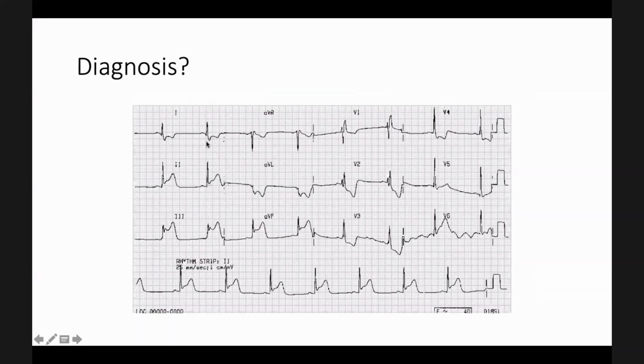Sinus rhythm, yes? You can see the P, Q, R, S, and the T's are of course not very clear, but P is there, Q, R, S is there, T is here. So it's a sinus rhythm. What are the abnormalities that you see in this ECG? Bradycardia. Yes, one thing is bradycardia, very good. You have to look at the rate. You can count. Usually the rate is 50.